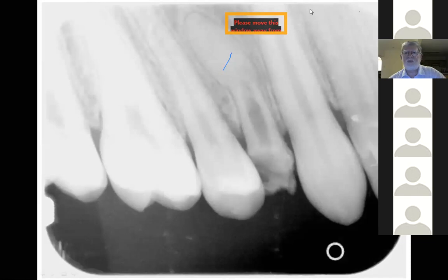So you look in the mouth, patient comes in, you think they've got a little bit of the 1-4 that's come through, that's remaining, and you think, okay, well, I'll just grab that and take it out, and you've got a big surprise waiting in store. What's the big surprise on this tooth? Yeah, both massive hypercementosis. That's not going to come out without a fight. It's interesting how you just don't see any pulp at all there.